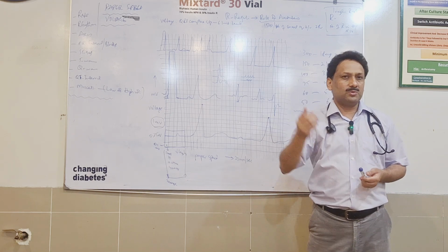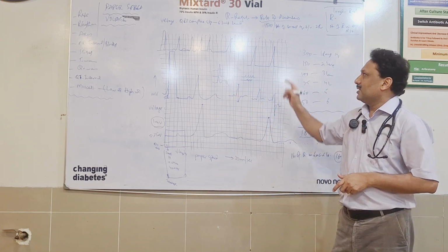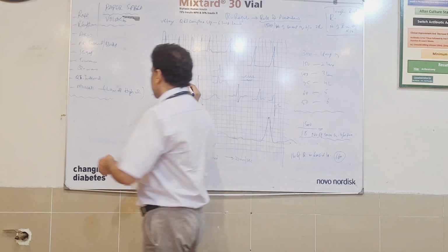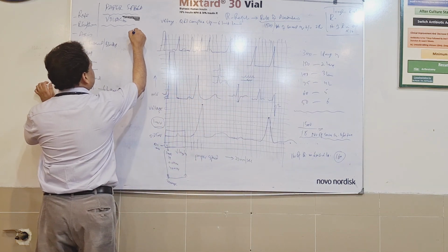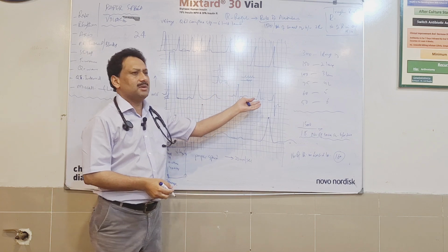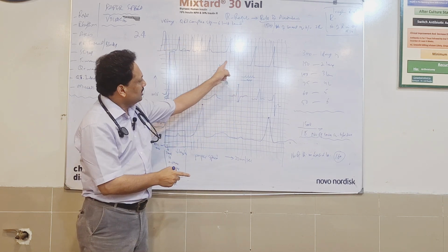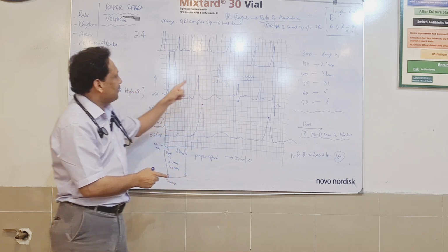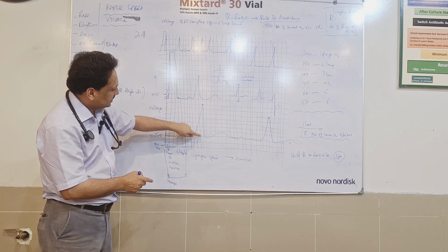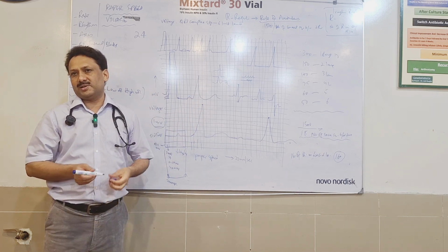So what are you supposed to get out of it? Count this size, and after counting the QRS complexes, say the answer comes out to be 24. It can be any answer. It can be 50, it can be 60, it can be 70. You just need to calculate the QRS complex size. Like this QRS complex is 1, 2, 3, 4, 5, 6, 7. Its size is 7. So just add all these QRS complexes.